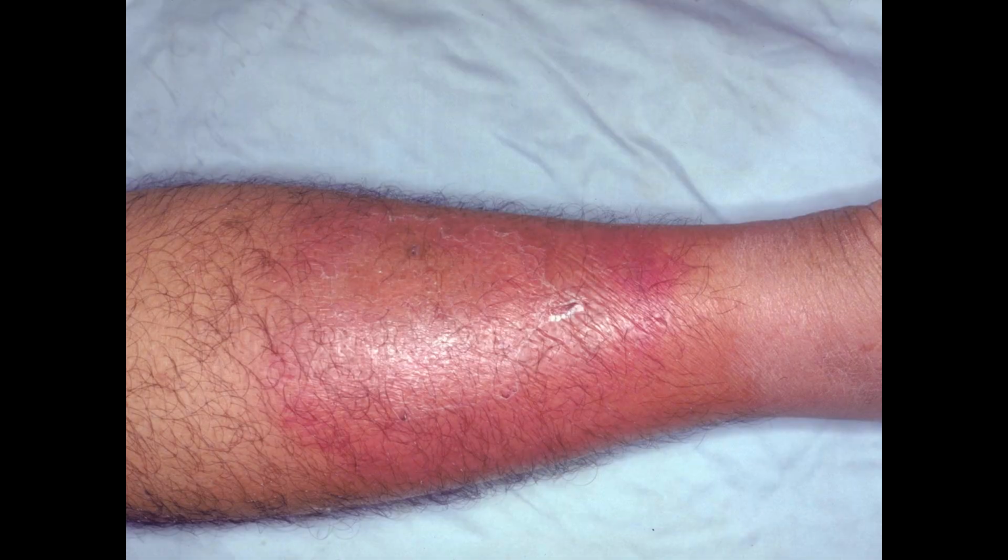What does the ultrasound appearance of cellulitis look like, and how can we identify that as we do our scans at the bedside? So just starting off with a little bit of a clinical image. This is a picture that I pulled from Google. So Google cellulitis, you'll get a bunch of pictures. And so in this particular one, this is an example of a patient who has some erythema to the skin, right? This is going to be an example of simple cellulitis.